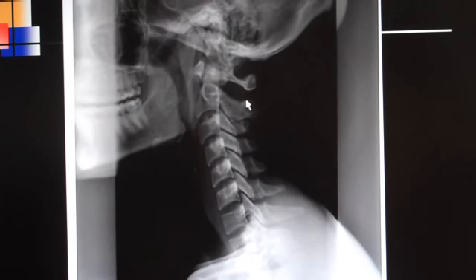Now, if you had a film with a missing spinolaminar junction line on C2, that is technically called spina bifida occulta. If you have a missing spinolaminar junction line on C1, that is called posterior spondyloschisis. All right, as we move forward, we'll go down to the next segment.